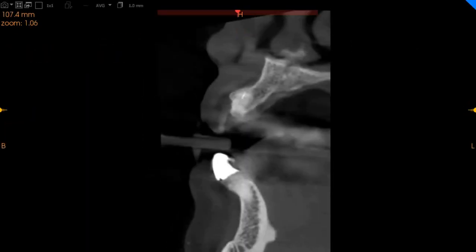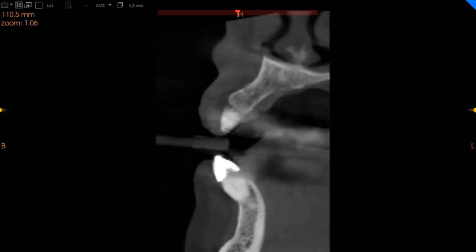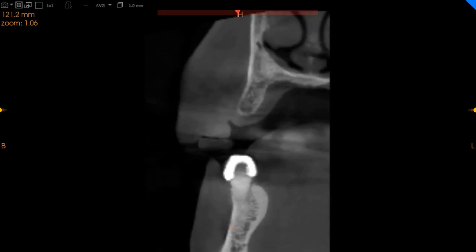This is where the BTR of the lateral is. If an immediate implant placement can be achieved here, you've got approximately 7 millimeters of width with a good 18 millimeters of height. In the premolar region, the first premolar has a slightly thin ridge, but we've got 5.6 mm of ridge width with a good 16 millimeters of height.